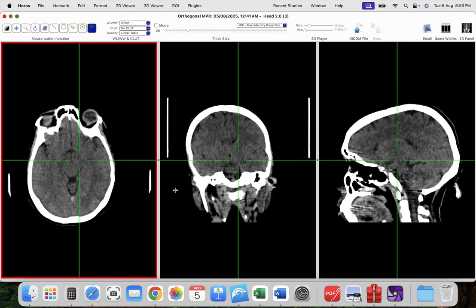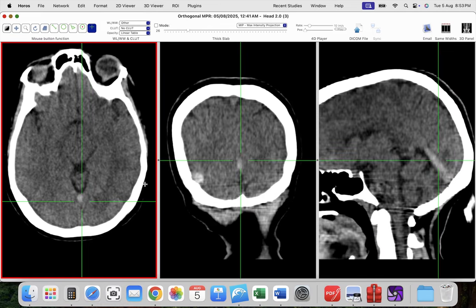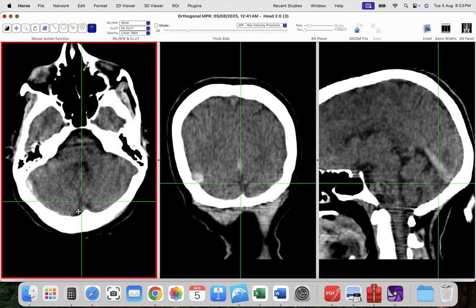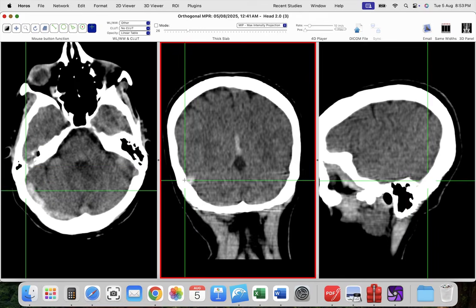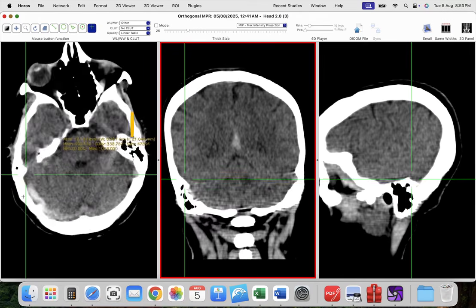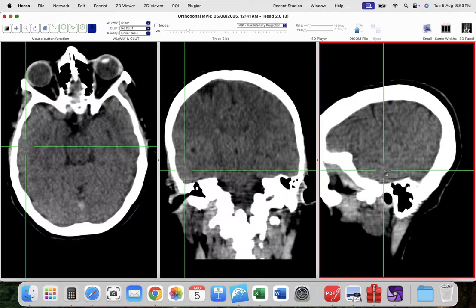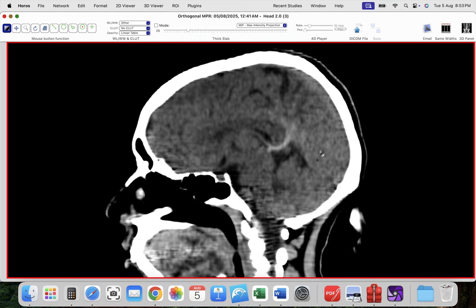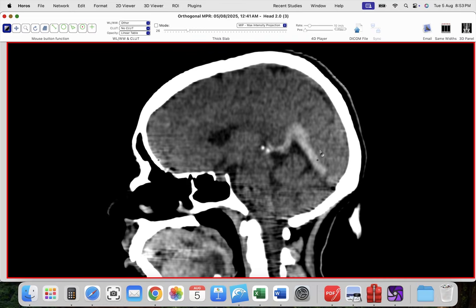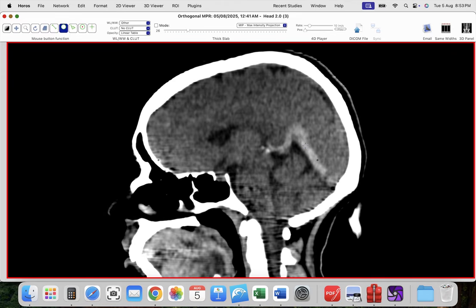However, by doing the multiplanar technique for assessment, we can see that this hyperdensity is matching with an anatomical site of the transverse venous sinus, and it is extending along the sigmoid as well as the straight venous sinus and internal cerebral vein, and by measuring its density we reached 50, 60 and 80 Hounsfield units at different sites.